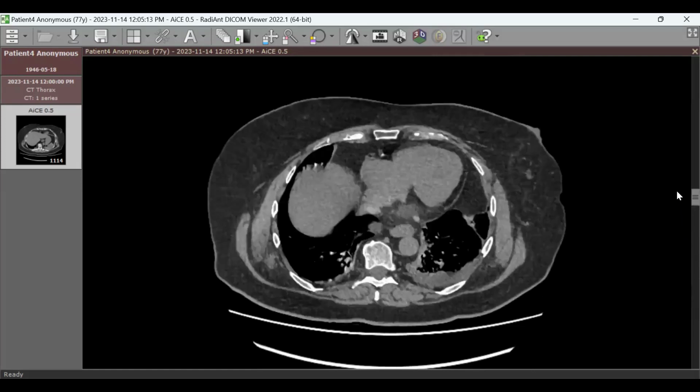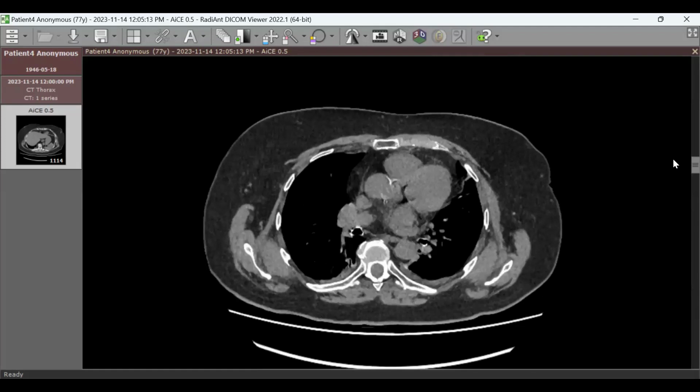And the last thing I want you to see, is there any other abnormality in this image? There is, deep to the latissimus dorsi muscle, bilateral soft tissue masses. Suspicion of bilateral elastofibroma dorsi. Good. Can you tell me more about this diagnosis?